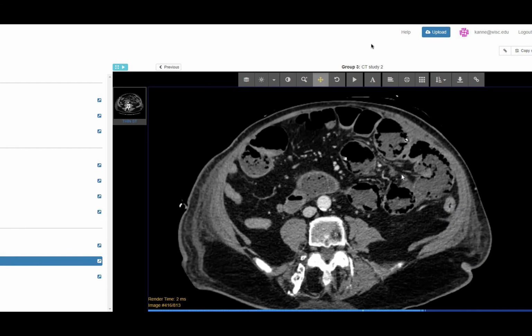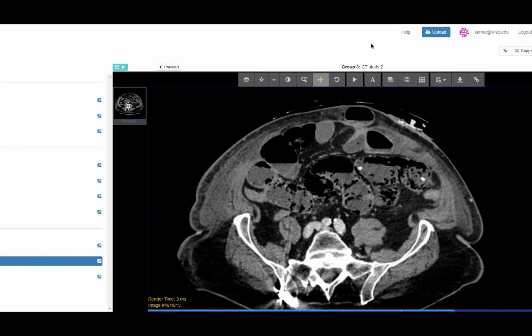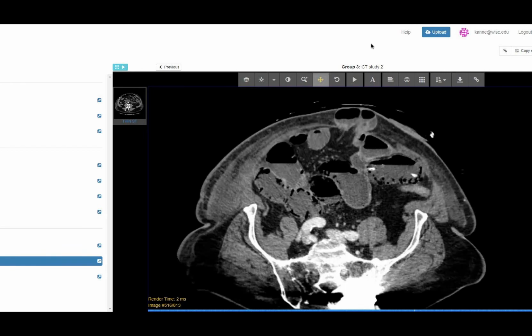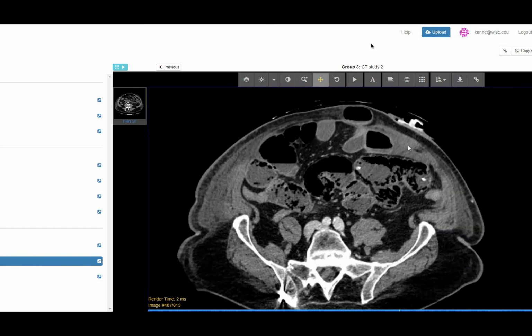But interestingly, there wasn't an obstruction of any real note, if I remember correctly. Just a sort of functional one, but they managed the patient conservatively, and it did resolve. But it's interesting that it tracked all the way back up into the conduit, and the conduit itself was pretty happy. You can see there's a feeding jejunostomy, so it's unclear.